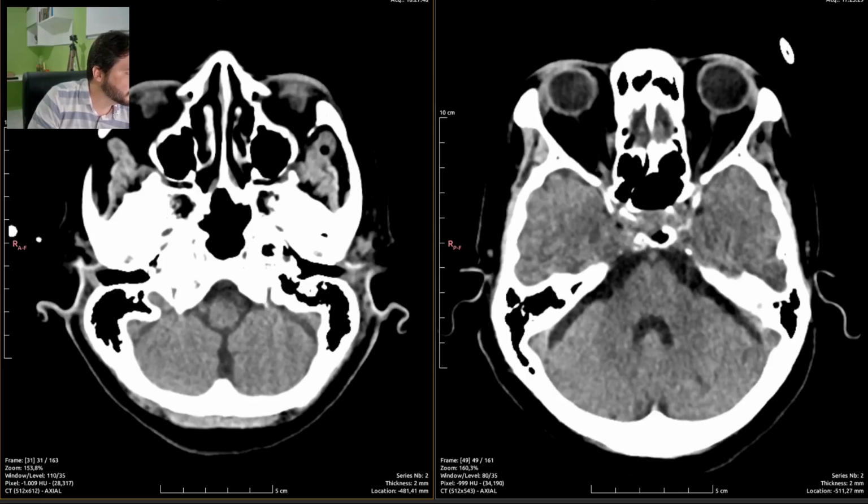Yep, subfalcine herniation. Yep. Yep. So we have finished.